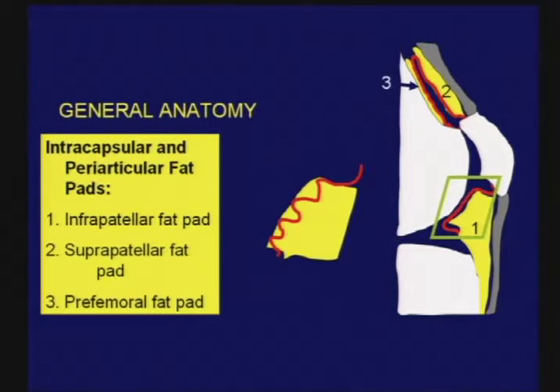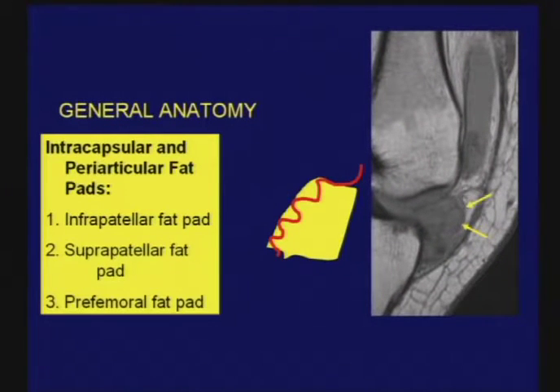If we return to that interface of the synovial membrane in Hoffa's fat pad, what we have found is the more aggressive the synovial process, the more likely that we will see obscuration and effacement of that interface between the synovium and the fat. Typical diseases that do that are rheumatoid arthritis, as shown here, pigmented villonodular synovitis, and septic arthritis.